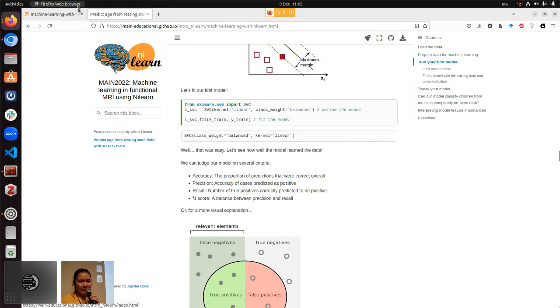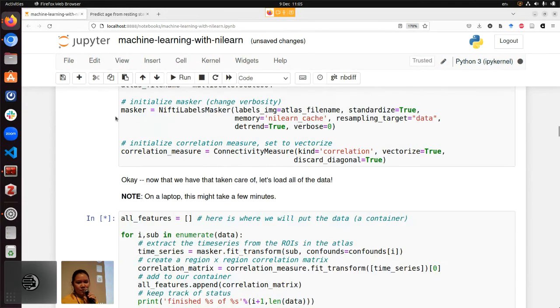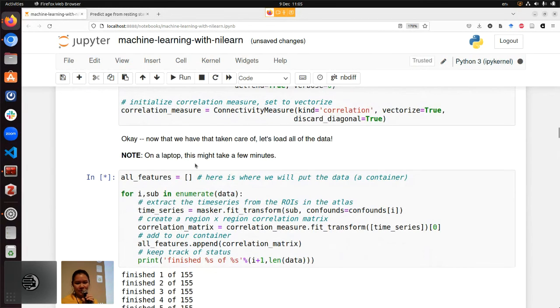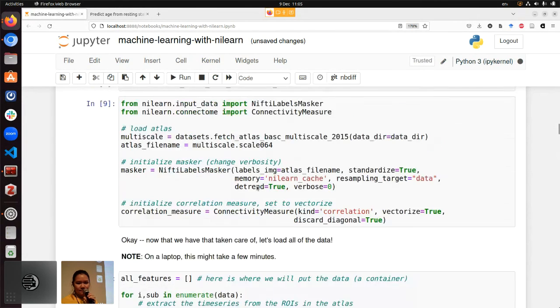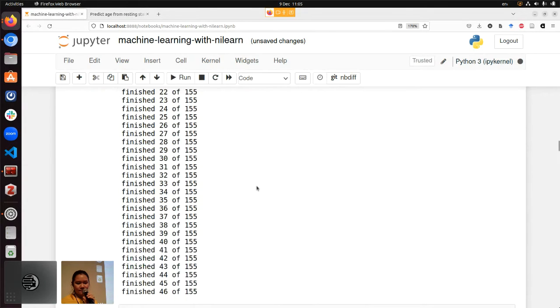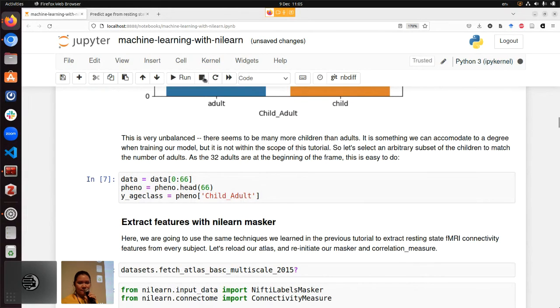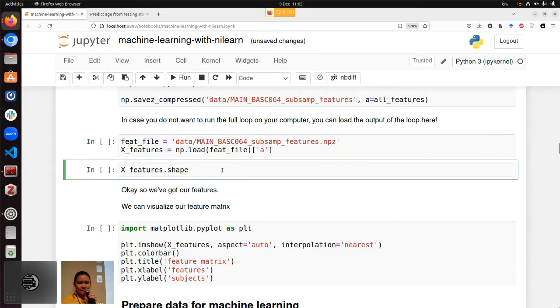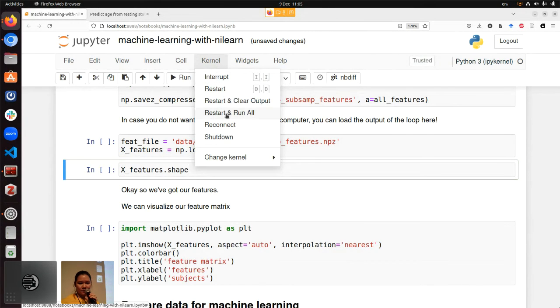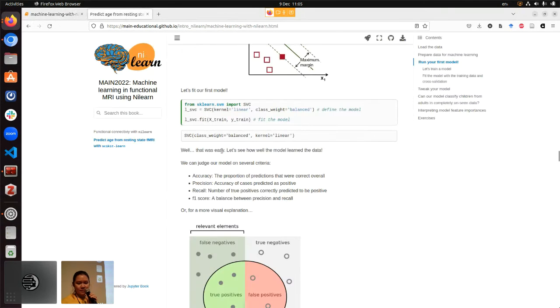So let's have a look at how this is doing. We're doing all right, and I don't know why I have so many. Anyway. Okay.